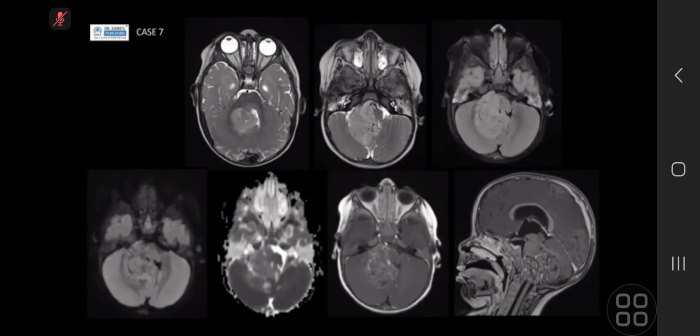I have provided my brain MRI. In the upper one, T2 shows there is a mass in the fourth ventricle with an irregular border. The second image shows this mass extending caudally in the fourth ventricle, with possible extension through the foramen of Luschka as well as Magendie.